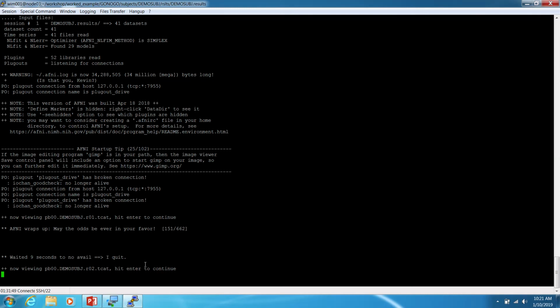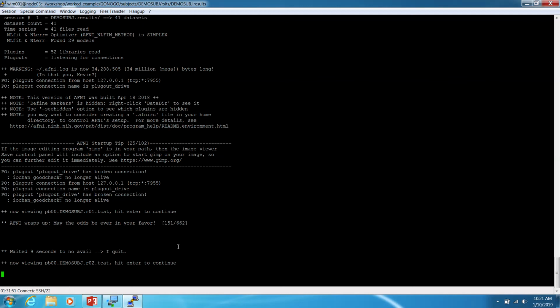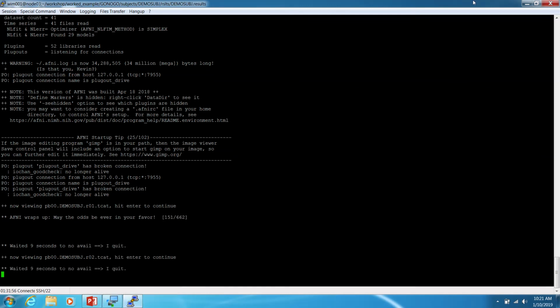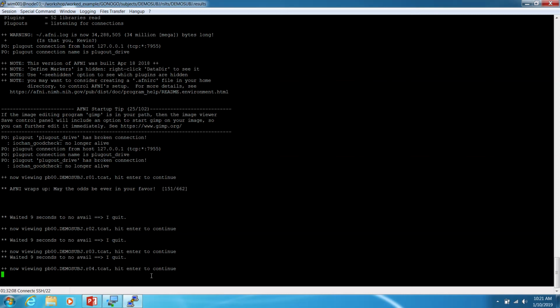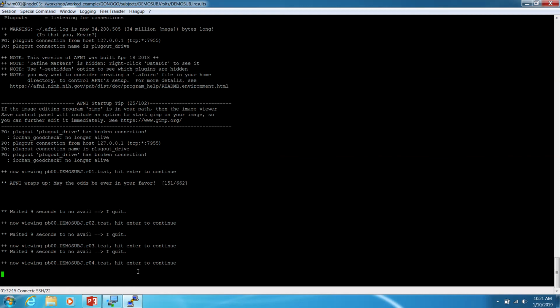Here we go. Yeah, so what happened is I closed the window and I was just supposed to push enter instead. So this will just take a second. But basically what it ends up doing is it ends up going through each of the 3 sets of runs, or 4 sets of runs in this case. So it ends up showing each piece as you're going.